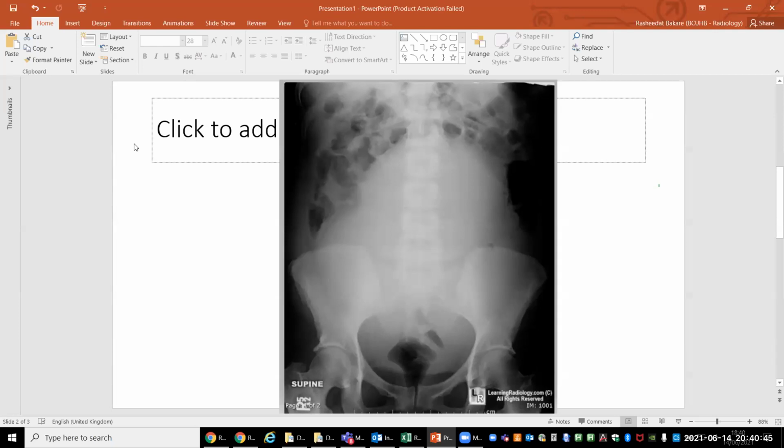As the soft tissue density lesion is arising from the pelvis and going up, I would ask if this patient is a female and would be concerned regarding an ovarian lesion. I would also keep a very large fibroid in my differentials as well. And I would advise an ultrasound pelvis as the next step in this patient.